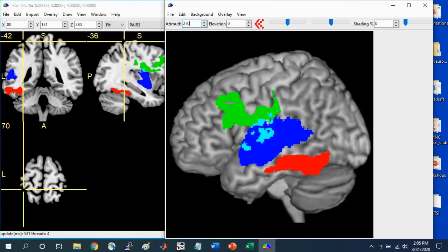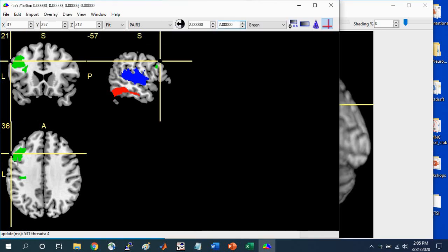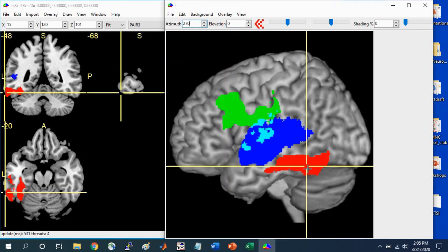So now we can see the left profile view, and we can left click on this green portion, and it'll jump to the surface of the slice view where we have the sagittal, coronal, and axial slices. It'll jump to that depending on where we click in the rendered view. Working with this allows you to gain a better sense for where the lesion is on the profile view, the surface of the brain, a surface rendering, relative to where you are in the slice view.